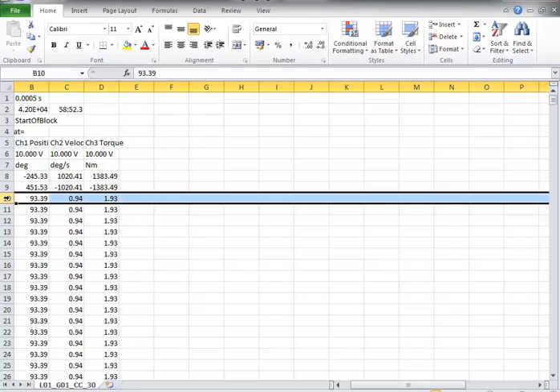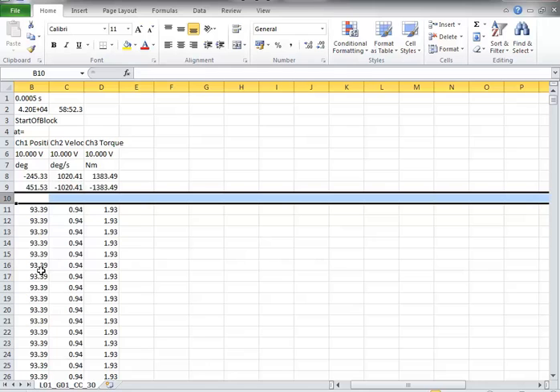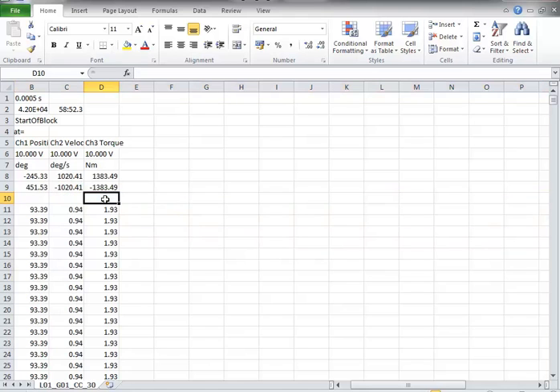Now you can do this wherever, this isn't a necessary step, but it just makes more sense to have the maximums on top. You can add labels wherever you want, obviously, so you know what that data is. Just remember, you might have to come back to this data at a later date and you need to be able to know what each value is, so make it logical.